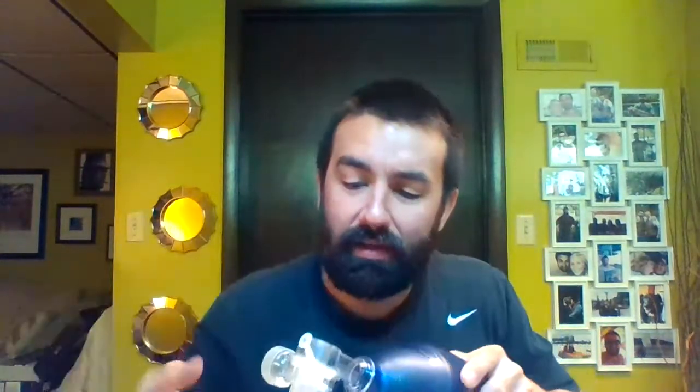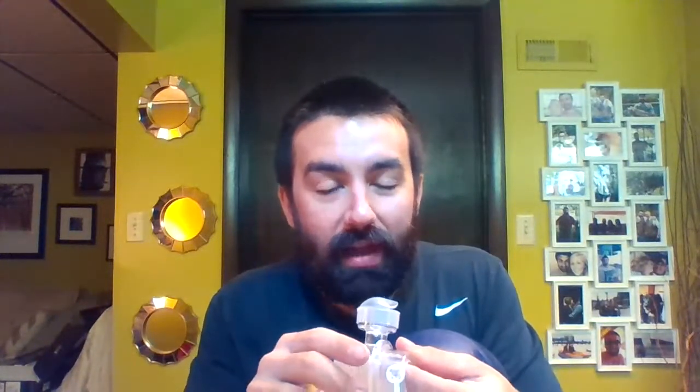The other thing people mess up with, you'll see this little opening on the back here, and they start trying to stick stuff in. It's just shaped that way because of the piece that the one-way valve attaches to on the inside of this. Nothing hooks up on the back side.